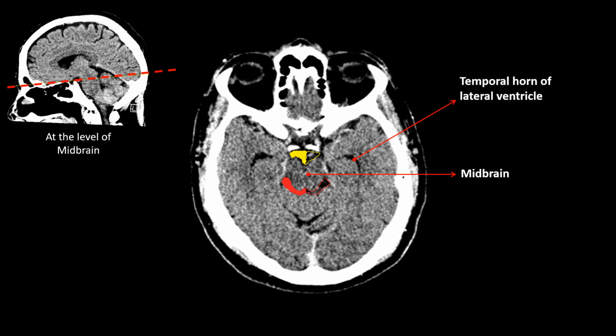Cisterns are compartments within the subarachnoid space where the pia mater and arachnoid membrane are not in close approximation and that CSF forms pools or cisterns. The suprasellar cistern, also known as the chiasmatic cistern or pentagon of basal cisterns, is located above the sella turcica, under the hypothalamus, and between the uncus of the temporal lobes.